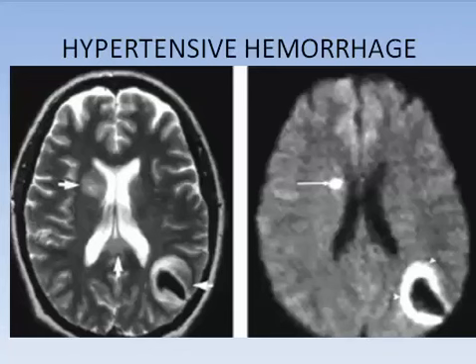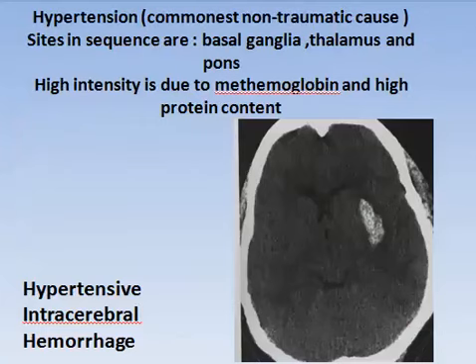Or early subacute. Acute hemorrhage or early subacute with the region of the infarct. So it is a hemorrhagic infarct, and this is a small infarct at the region of the caudate seen as restriction. So acute and early subacute shows dark T2, as we said.